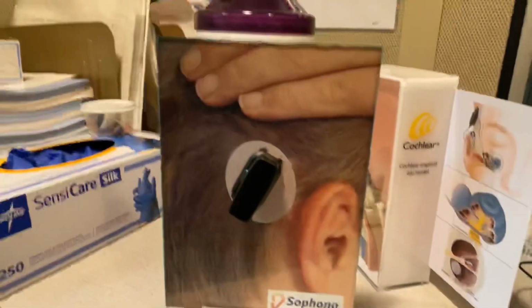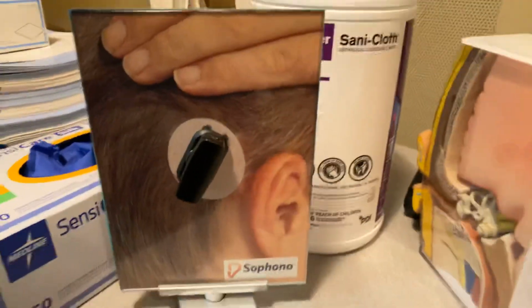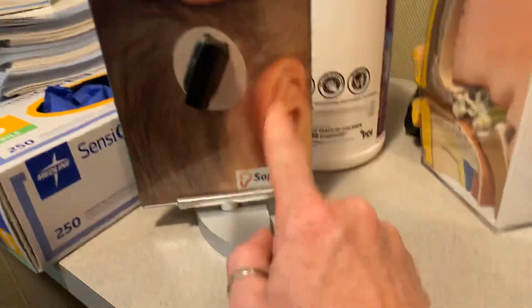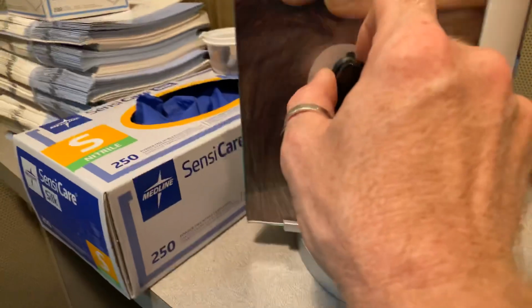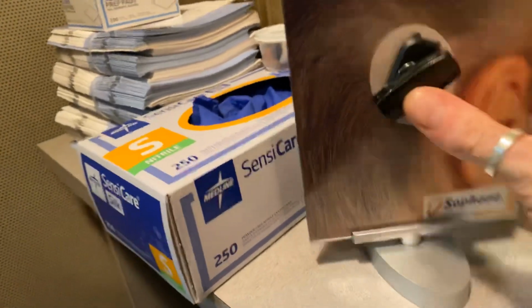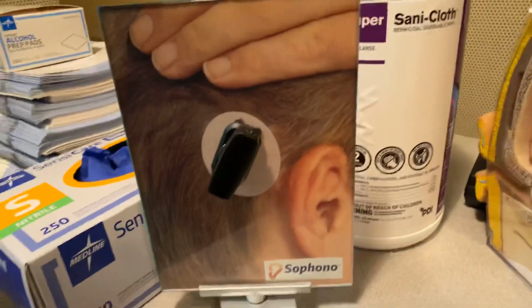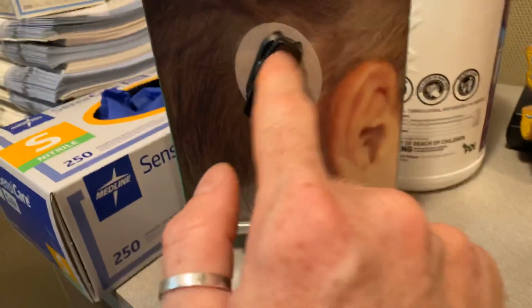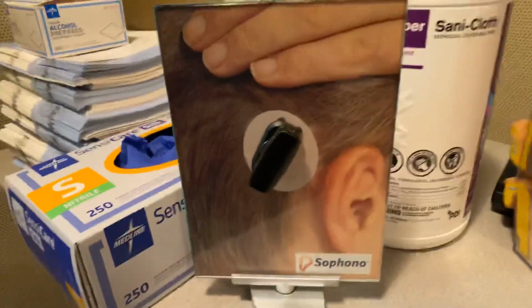Bahas are good for conductive hearing losses of any shape or configuration, but they're also good for unilateral profound hearing losses. Let's say this ear was deaf, the right ear. We would put a Baha on this side, and sound wave energy coming in right here on the right would vibrate the entire skull and get picked up by the cochlea on the left.